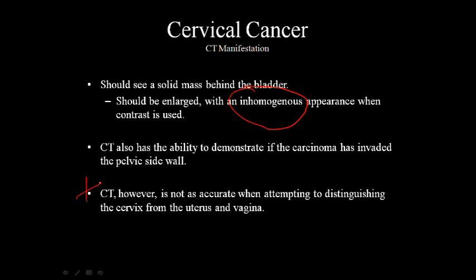That's one thing that you're really going to have a problem with, and I would not even begin to question on an exam whether this is uterus or vagina or cervix, because everything in terms of the structure tends to run together. And that's one of the downfalls with CT, is that we cannot distinguish between these areas because there's no density difference usually.